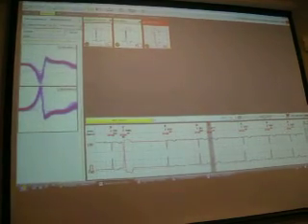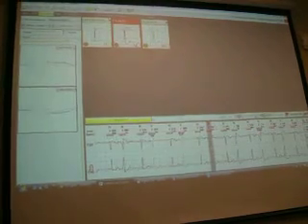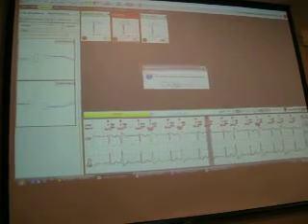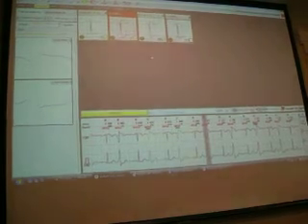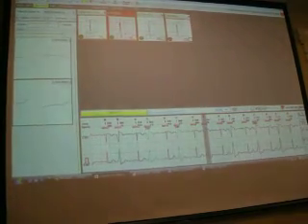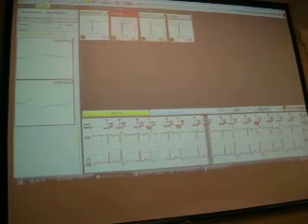This is the new cluster. The next cluster, I will take 2 QRS of them, and the next step is to set the correct QRS type on each cluster.